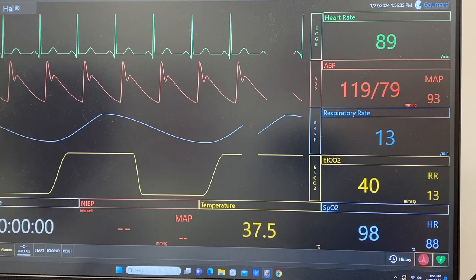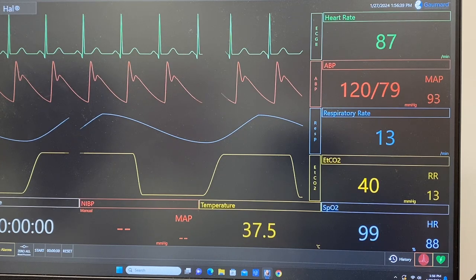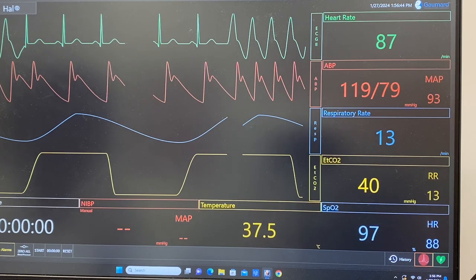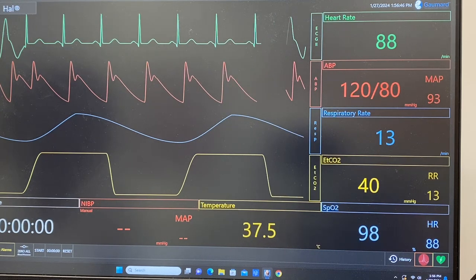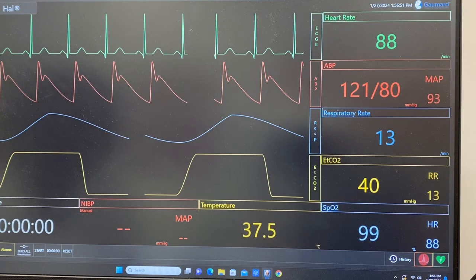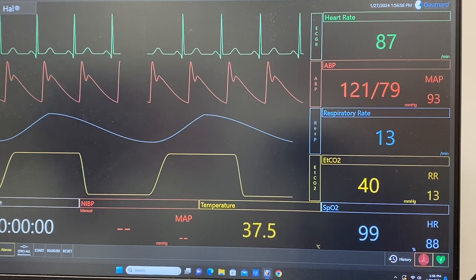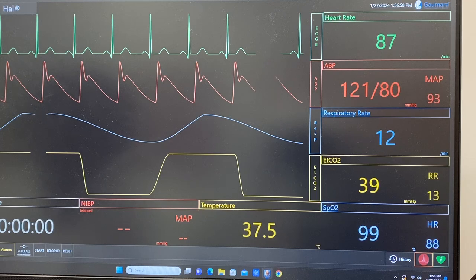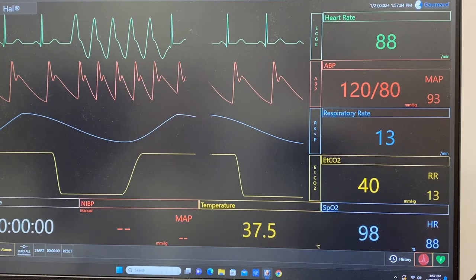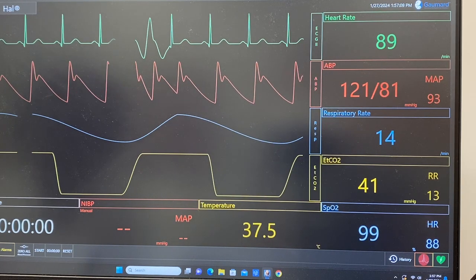So you can say, what is the underlying rhythm? Normal sinus. So this is NSR with VTAC runs. What's the danger in a VTAC run? The ventricles are contracting prematurely, like multiple times. Okay, and then what could that lead to? VFib. Nope, not yet. Ventricular tachycardia. It could lead to a full-on VTAC.